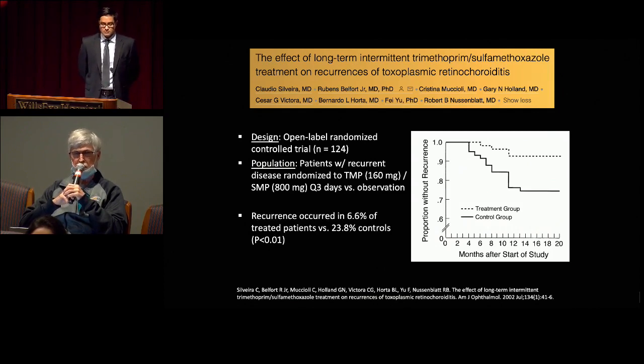I worry less about peripapillary lesions than parafoveal lesions. Peripapillary lesions tend to cause less long-term problems. Parafoveal, once you have foveal tissue destruction, you're never going to get it back. So I'm not sure that I would start it in this case.